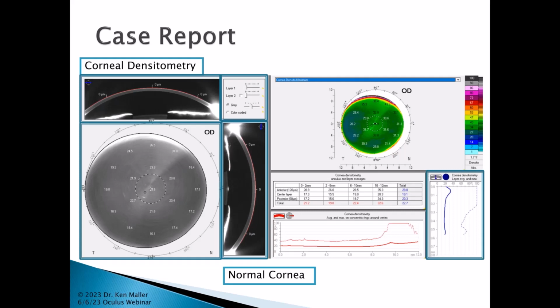The dotted blue line on the right-hand side is taking a look at wherever the maximum reflectivity is, and how much reflectivity is coming from that particular spot. The solid blue line is really the entire corneal average. So that's actually the more important value that you want to see. And again, the more to the left, the better that we can get light through. The more to the right, the worse it's going to be to get light through that eye.